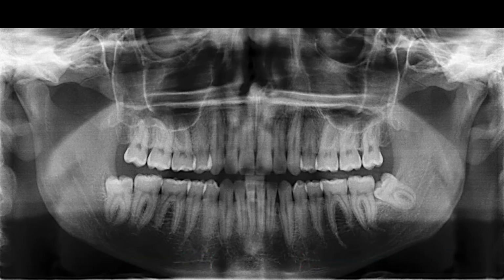So now that we discussed how the x-ray is set up, next let's talk about what we're looking at. The way x-rays work, anything that's very, very dense blocks the x-rays and will show up as white. If you look closely up in here, you see all this wispy white stuff. That's because in that part of the skull, there's a lot of bone the x-ray beam had to pass through.